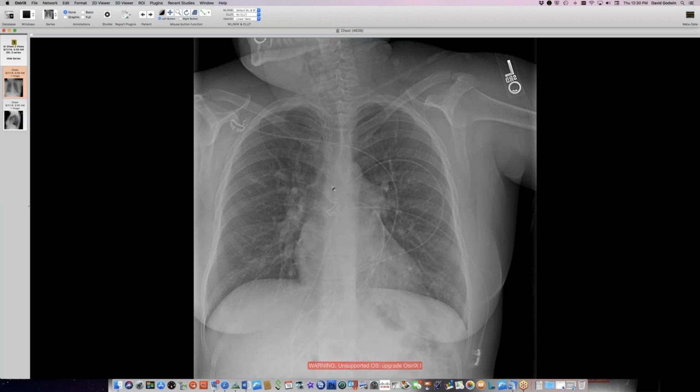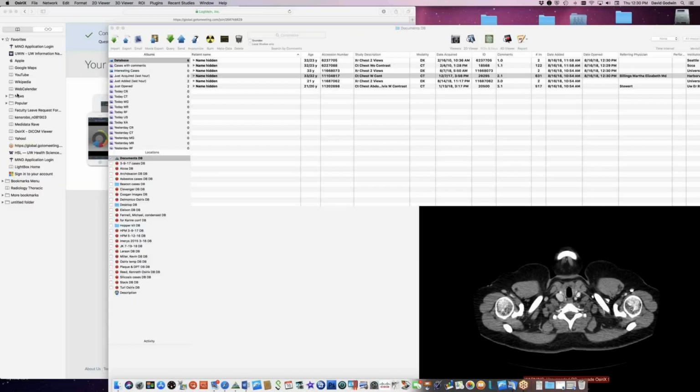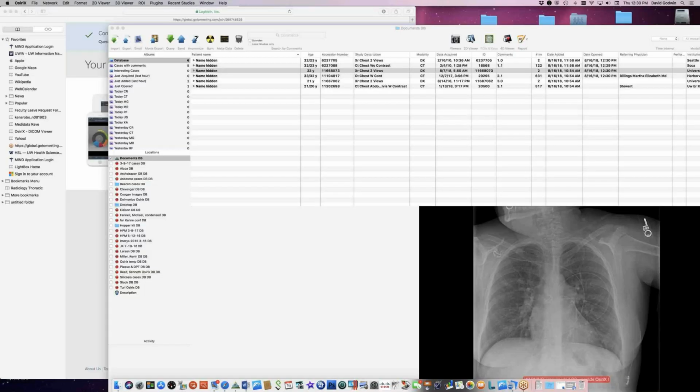Now, here's a person who has a pretty normal chest radiograph, a little bit of basal atelectasis down here, nothing special on lateral view, slightly low lung volume, and had this. Before you show anything, can you go back to it 1 second? Sure.